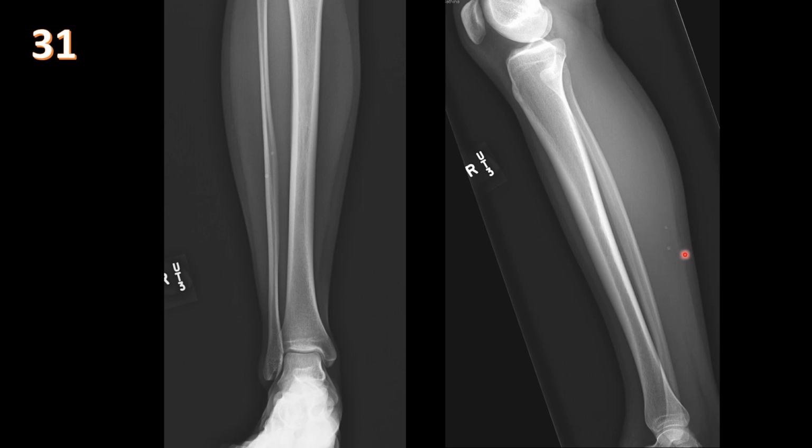Case number 31, we have AP and lateral views of the right leg, and we see that there is some rounded calcification with a lucent center in the soft tissues of the mid-posterior leg, and this is consistent with phleboliths. So we're thinking that there is some type of vascular malformation within the soft tissues.